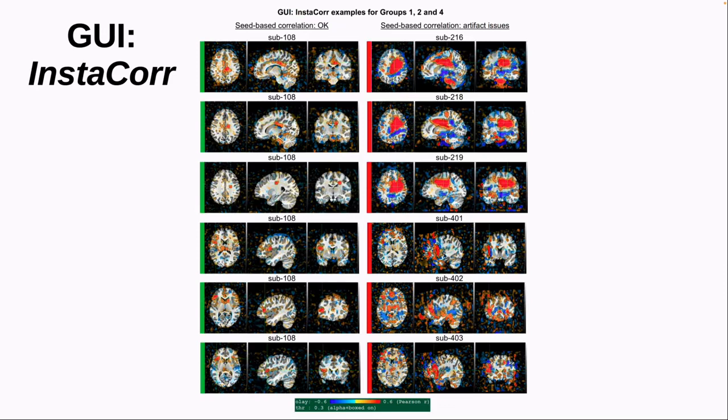And this was the 400 series subjects that I just talked about with those lines. You can see these kinds of artifacts would show up. We also have the 200 series of subjects, the site 2, and this ended up also being excluded for the whole group, because all subjects ended up having these high correlations that weren't physiological.